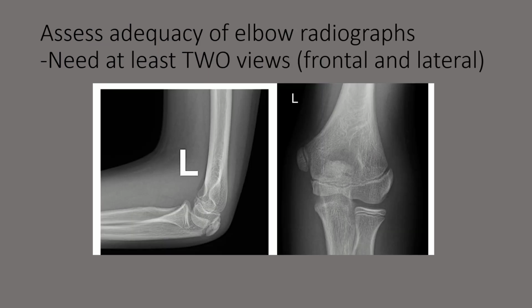For an elbow radiographic exam to be adequate, at least frontal and lateral views are necessary. This slide demonstrates normal frontal and lateral views of an elbow.